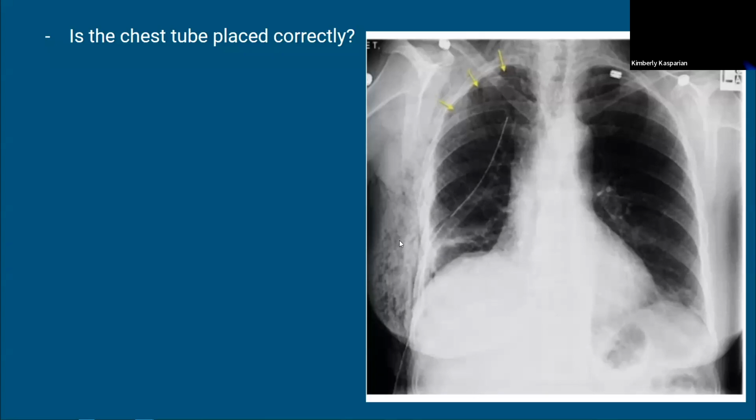You put them in here. Looks a little traumatic, some acute air. So it's in, and you want it to be in far enough, whether it goes up here, whether it goes this way, whether it sits down here, that's fine. But you want to make sure this port is past the wall of the pleural lining. Otherwise this will be out here and it'll start sucking air and you'll wind up not resolving this little apical pneumothorax up here. So that's how you tell.